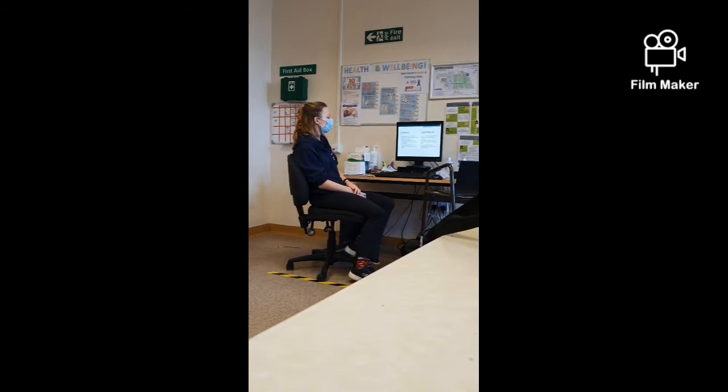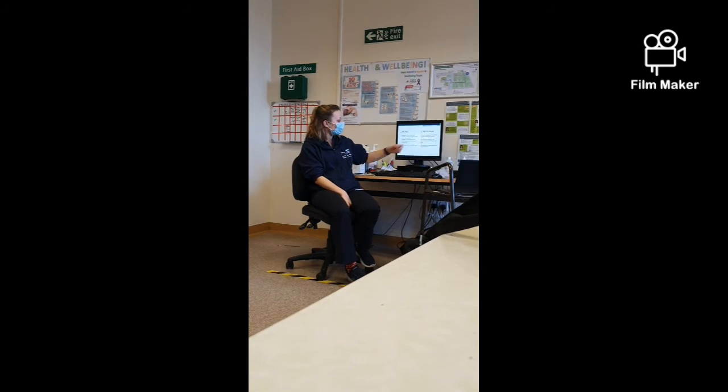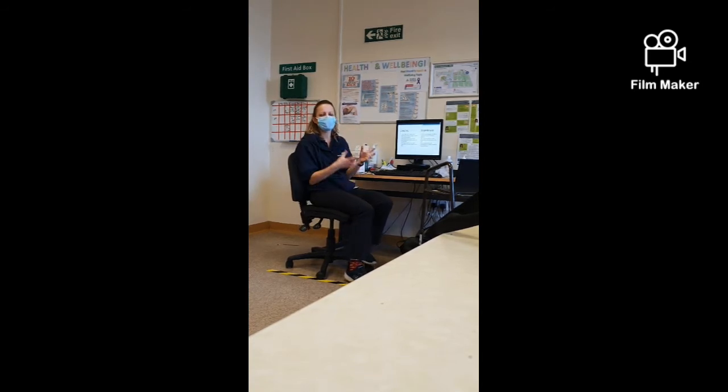But we're looking at the diaphragm, we're making sure that they're pretty level, and also we're looking at the cardiophrenic and costophrenic angles. In a normal chest x-ray, those angles should be clearly defined, you should be able to see them. If you can't see them, something's going on, whether that's an infection, a bit of pleural effusion, something like that. So as you go through that approach, if you pick things up, it's then looking in a little bit more detail just to see what else might be going on.